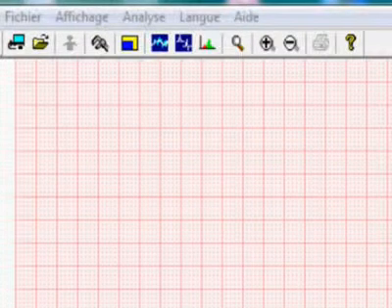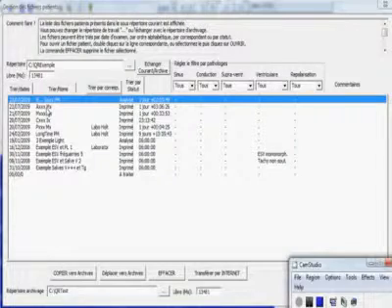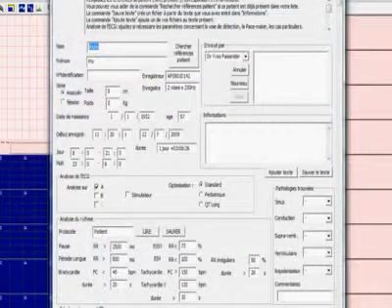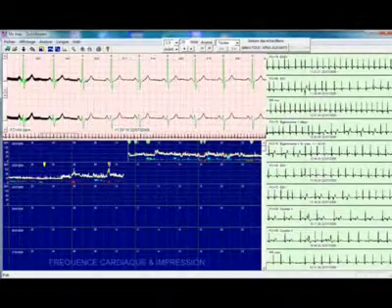We're going to open a file on your PC hard drive. Click on the icon Open a File. A list of current patients in the subdirectory QRExamples is displayed. Double-click on the name of a patient to open the file. Identification box, click OK, and the patient data will be displayed on the screen.